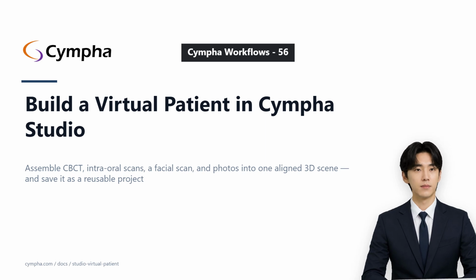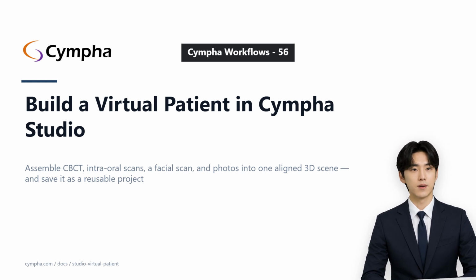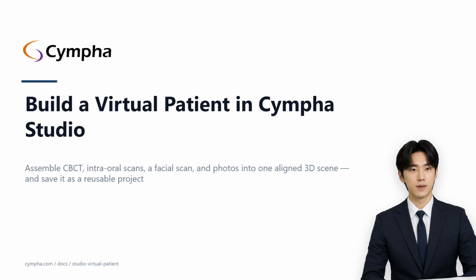Welcome to Guide Mia. Today we're going to talk about building a virtual patient in Cympha Studio. A virtual patient is one three-dimensional scene that holds everything you have for a single person. The CBCT volume, the intraoral scans, a facial scan, and reference photos, all aligned in one coordinate frame.